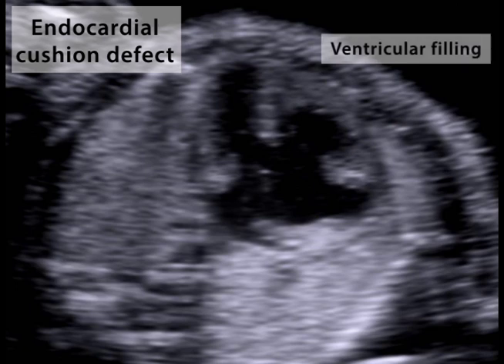During ventricular filling, opening of the mitral and tricuspid valves more clearly demonstrates their absent medial leaflets. This makes the absence of the tissue that would normally form the crux of the heart even more obvious, as highlighted here.